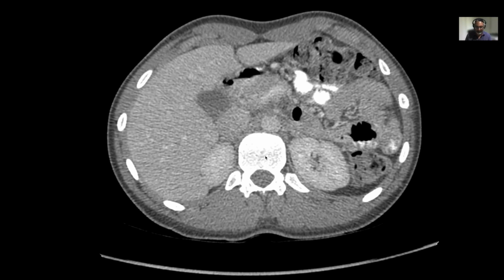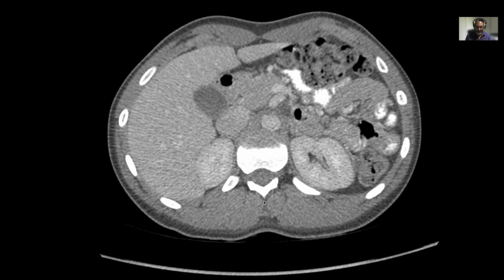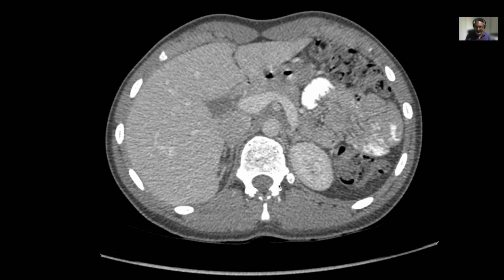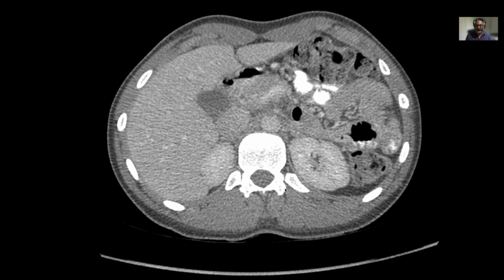And if you look at the vertebra, this is the vertebral body. This is the pedicle, the lamina. Then there's the spinous process that if you scroll up and down at some level you will see. That's the spinous process. The transverse processes on the 12th vertebra are actually a bit small, but there are these transverse processes over here that you can see. That is a thoracic vertebra, though not a typical one. T12 is not exactly typical. There you've got the vertebral foramen, in which the spinal canal exists, and the spinal cord exists within there.